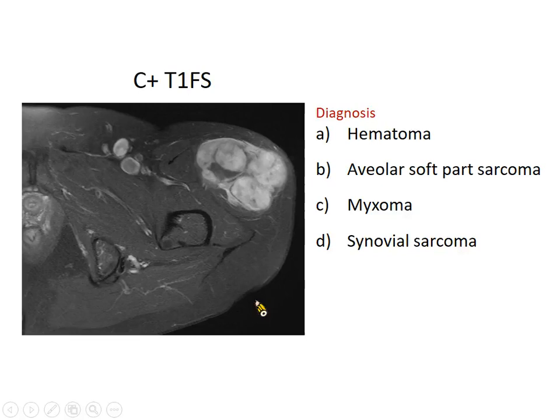So usually when we look at a tumor, we check the plain film whether the tumor contains amorphous calcification or not. And the second, the typical synovial sarcoma usually has a lobulated cystic component with many cysts combined together. If the case with calcification is more difficult, okay?